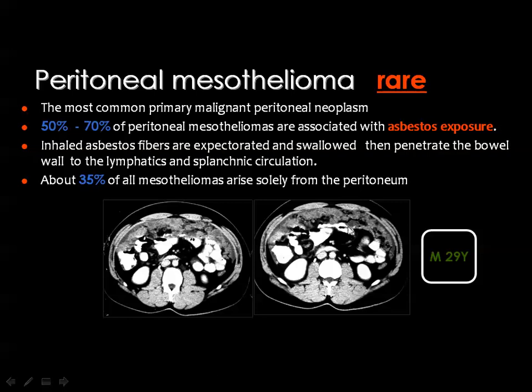And you remember that this is the site of the greater omentum, and you see a big mass which is infiltrating the greater omentum, which is just posterior to the anterior abdominal wall. The best diagnosis for this appearance is peritoneal implants, or what's known as omental cake, especially if you know that the patient had a primary malignancy that can metastasize through the peritoneum.